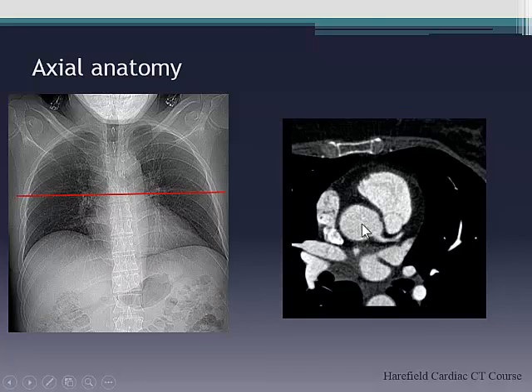Okay, moving down. Often what you'll see, because of the way the heart is angulated, is the left main stem coming in first, or the left coronary arteries before the right, because the heart's tilted that way. So if you look here, you can see it's the left main stem. When you're looking at the origin of the coronary arteries, it's much, much easier to look at it in the double obliquity of the aorta.